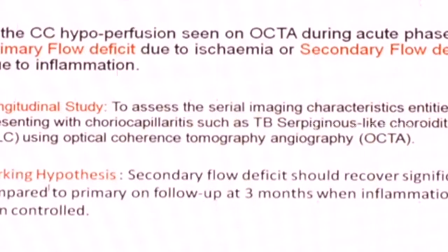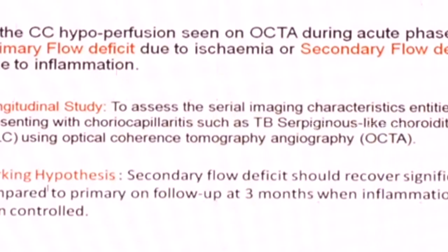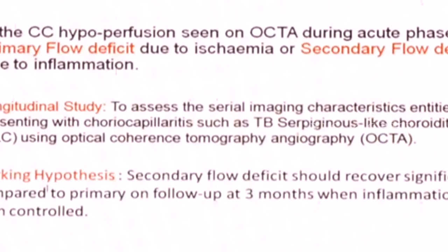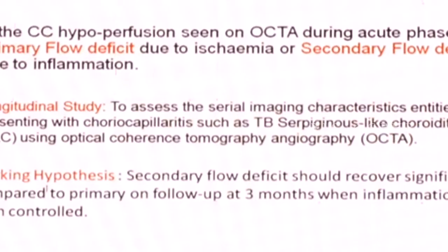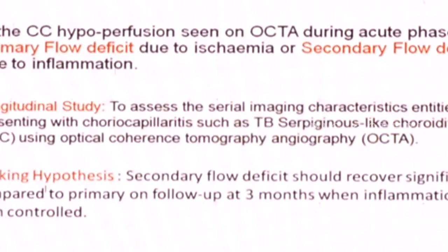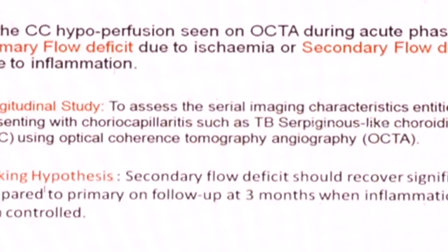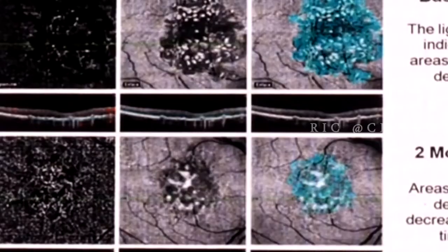So we did a longitudinal study of the same cohort of patients and repeated everything, including the ICG, at 3 months, with a working hypothesis that secondary flow deficit should recover significantly compared to the primary at follow-up at 3 months. Now I will show you what happens.